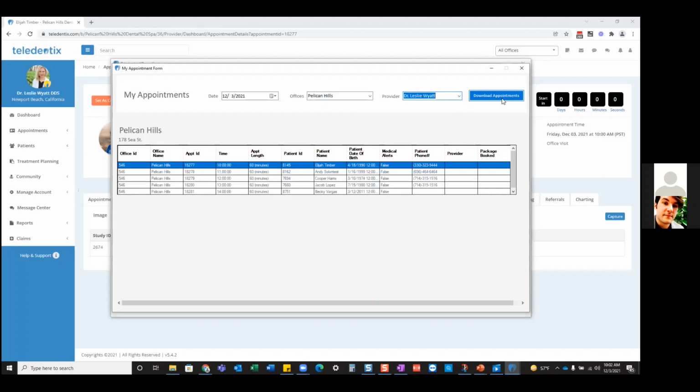Now, I've already downloaded this prior to the webinar because I actually have a recording. I can't show you guys in real time, obviously, if I'm offline, right? So I did record that, and I'm going to go ahead and play that for you in just a second. But I want you to see what the preparation steps are. And it's as simple as this, right? As long as I do this before I go on site, I am good to go.